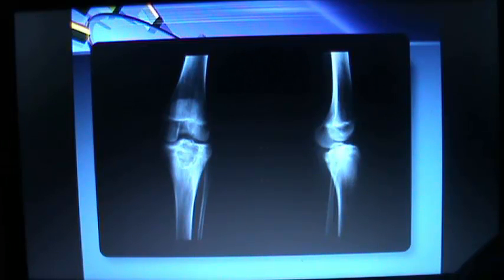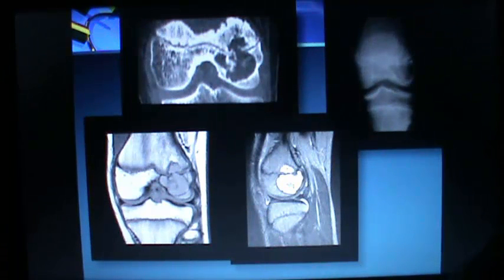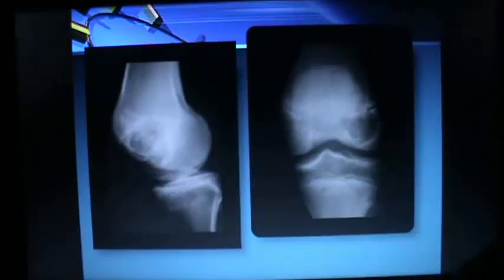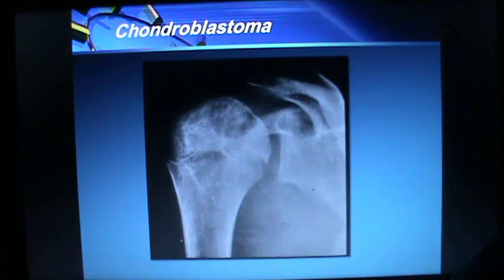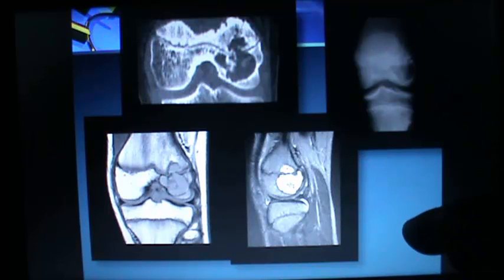It's chondroblastoma. But notice that if this chondroblastoma occurs in the vertebrae, it can give another appearance. All of these are chondroblastoma, epiphyseal, metaphyseal. The usual or common site is the humerus. And being chondrogenic, there is low intensity within the tumor.